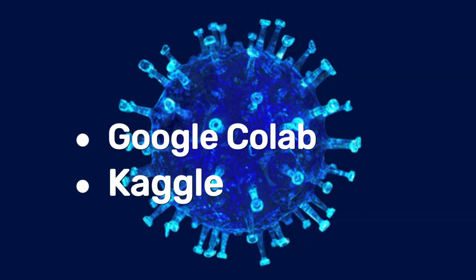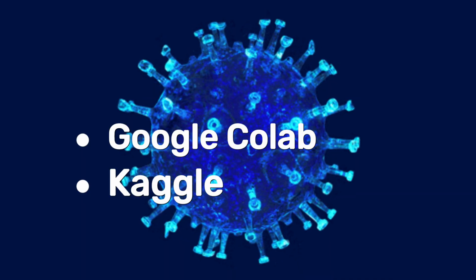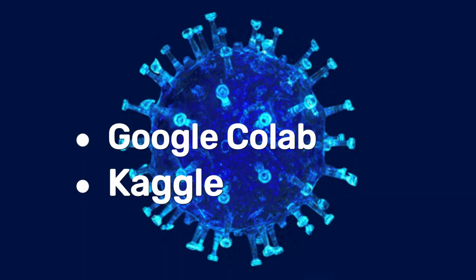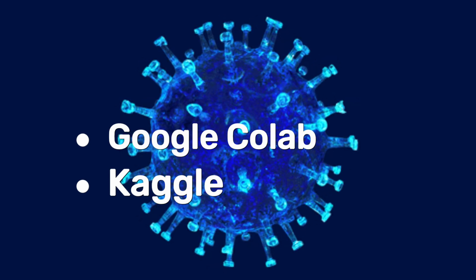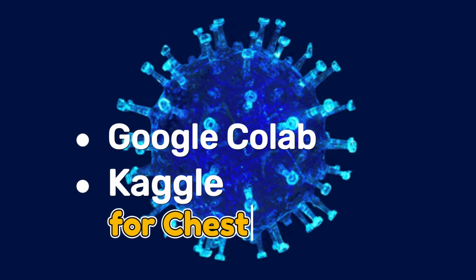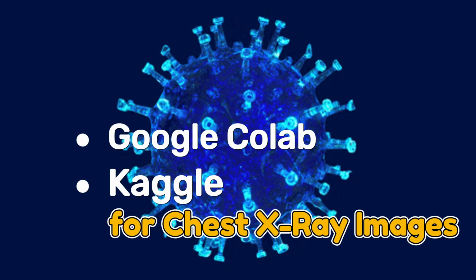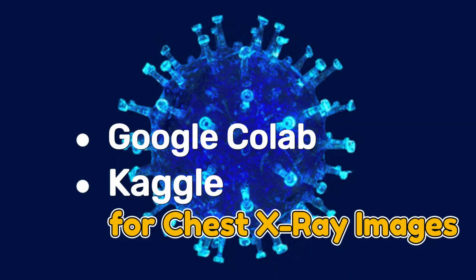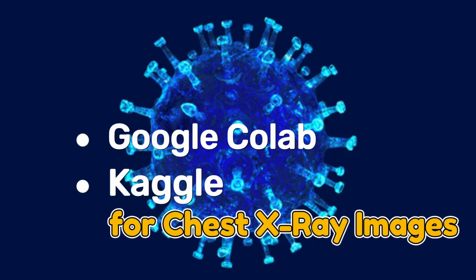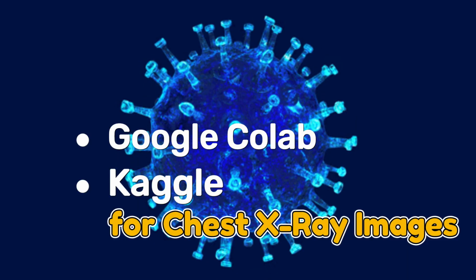So the application that I'll be implementing is based on X-ray images of patients that are either suffering from pneumonia or are healthy. I'll be using the Kaggle database, that is an online platform to store your databases. There are a variety of databases that you can access from Kaggle, and I'll be implementing this project using Google Colab.